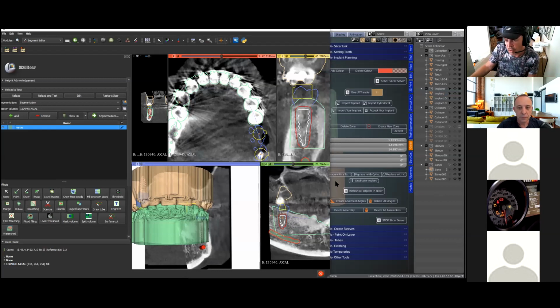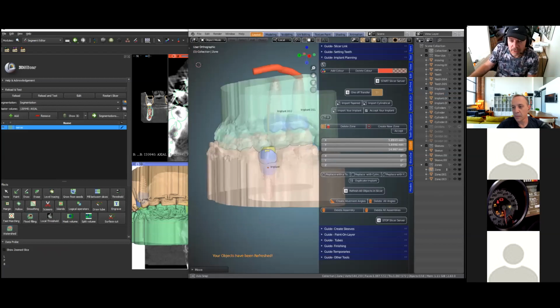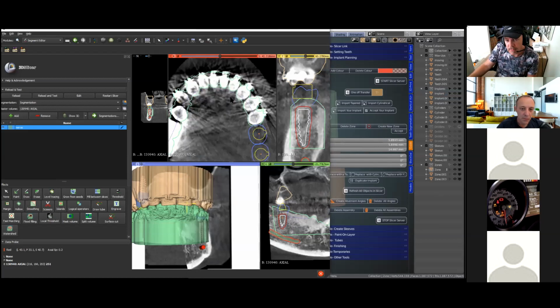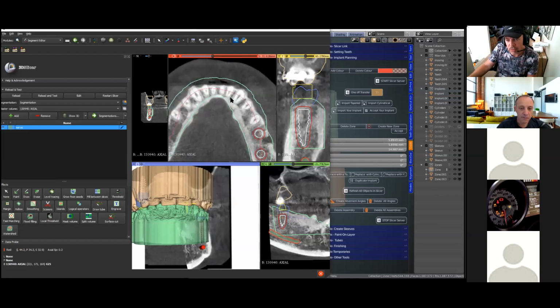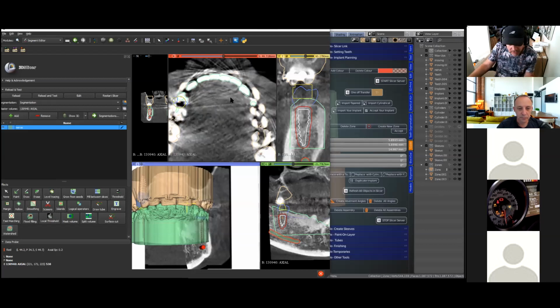Now we're going to move to the top one, and this is quite a tricky one. So I'll scroll through. Here's the top one. Hold Shift on your keyboard and move the mouse.